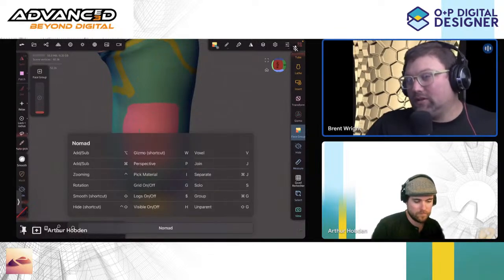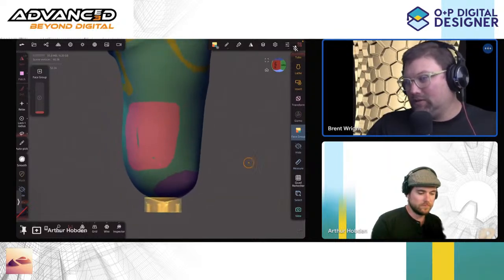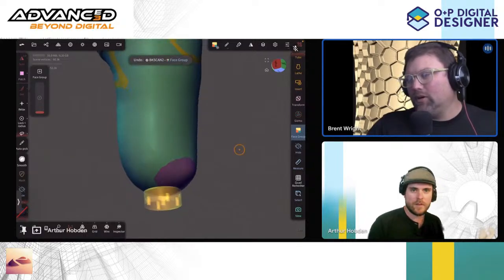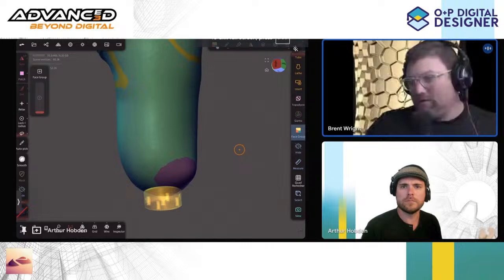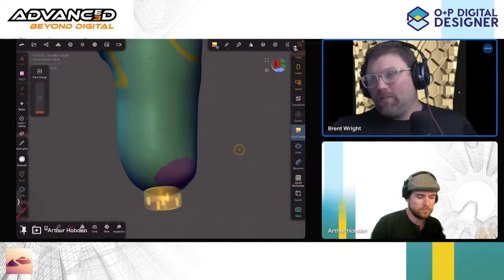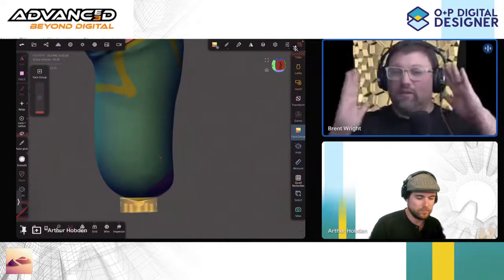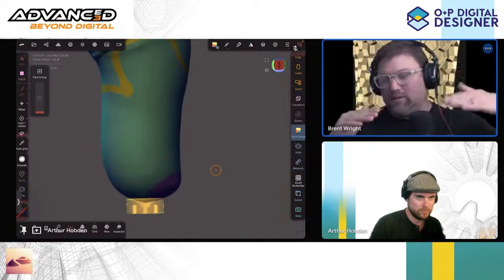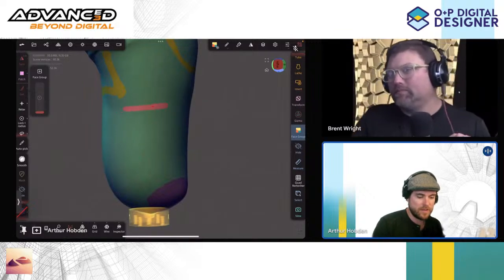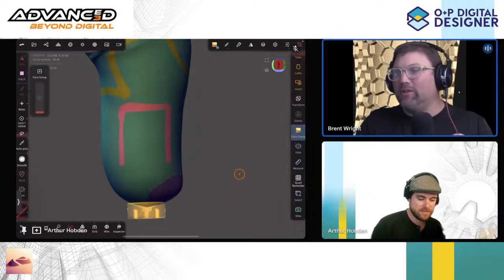Well, there's actually two. You'd have two sections that you would blend together. You'd have your first that's not going to be touching the bone. What I would start with is the ones that are going to be pretibial. On the medial side, you'll have one zone that's going to be the exact same as the lateral side, the interosseous space. And if I drew a shape, where is that on this? That is medial, so that would be loading the medial flare.